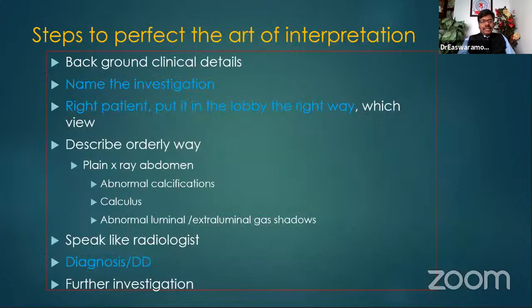When you see an X-ray right in front of you, as I'm posing it here, the first important thing you should do is anticipate from the examiner, or you may politely ask, what the patient's symptoms are. Background clinical detail is very, very important to make a diagnosis. You may be an excellent pathologist or radiologist, but still, if you're not provided with enough information, you can't make a diagnosis, can you?